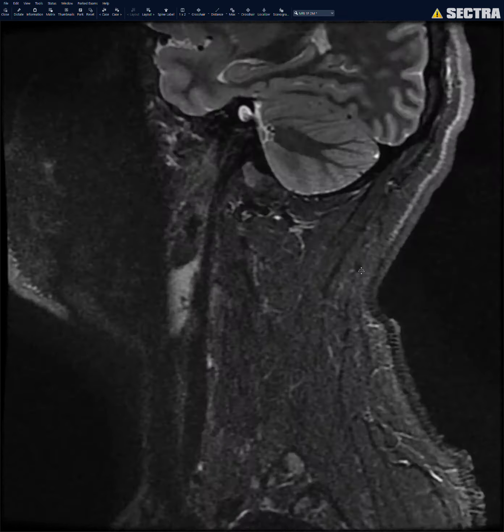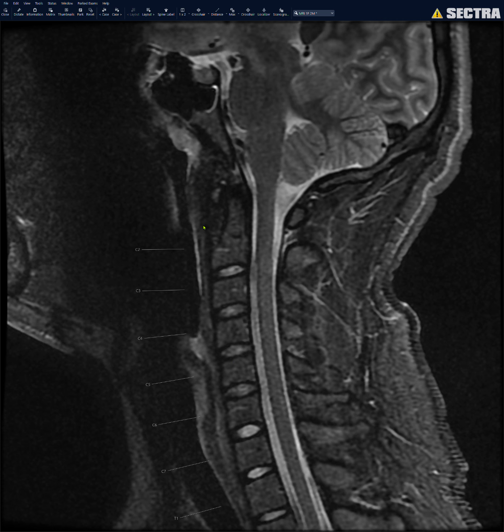Great. And then very importantly, I look for prevertebral edema, okay, which can be seen in the setting of anterior longitudinal ligament injury. Sometimes if you have life support tubes like an ET tube, it can cause some reactive retropharyngeal edema. So that can be a little confusing, but normally there shouldn't be any prevertebral edema here. Okay, great. This is a great sequence for looking for masses, looking for ligamentous injury, and looking for edema.